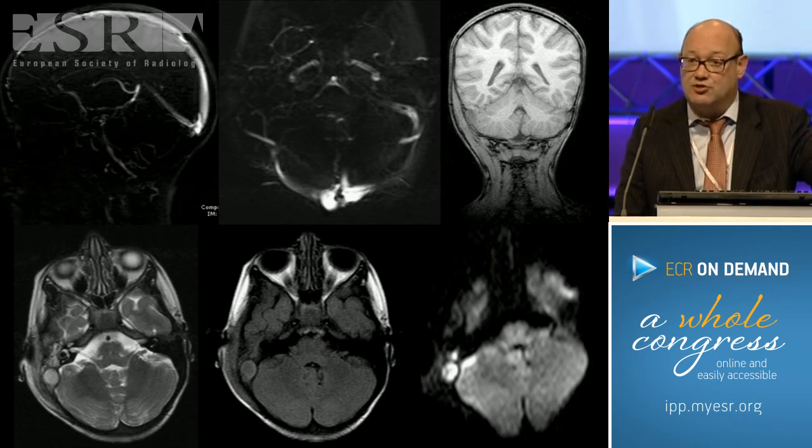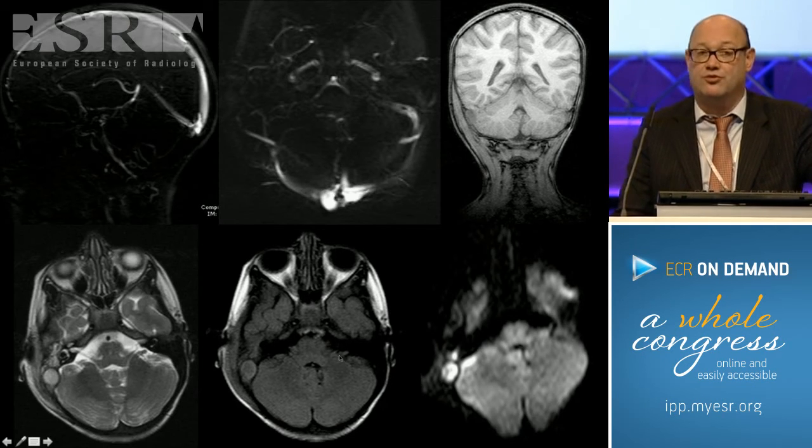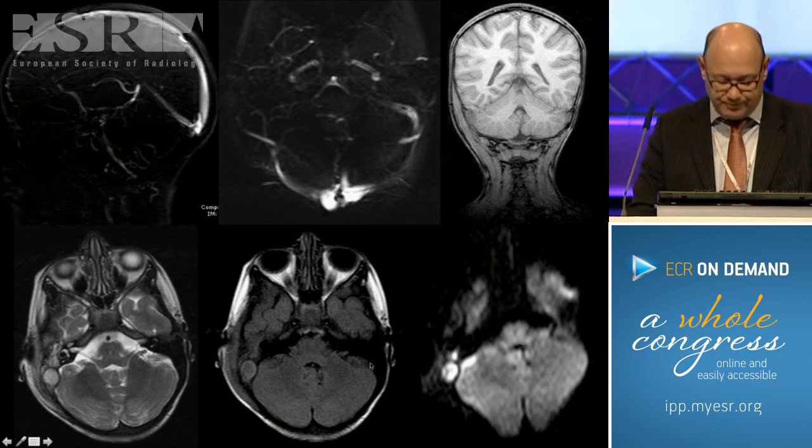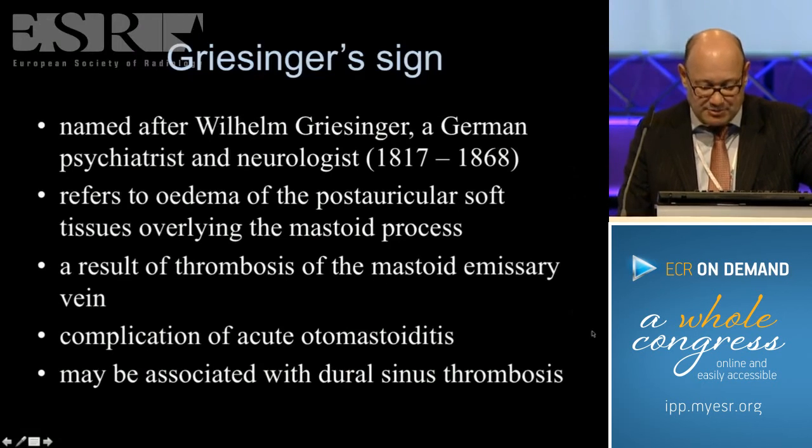In the same child, we performed MR, which showed a normal aspect of the superior sagittal sinus and the straight sinus, but showed a clear abnormality in the right sigmoid sinus. And one of the sequences which is also very sensitive to pick up dural sinus thrombosis is diffusion-weighted imaging, where the clot will show restricted diffusion, with high signal on diffusion-weighted imaging and a black signal on the ADC maps.